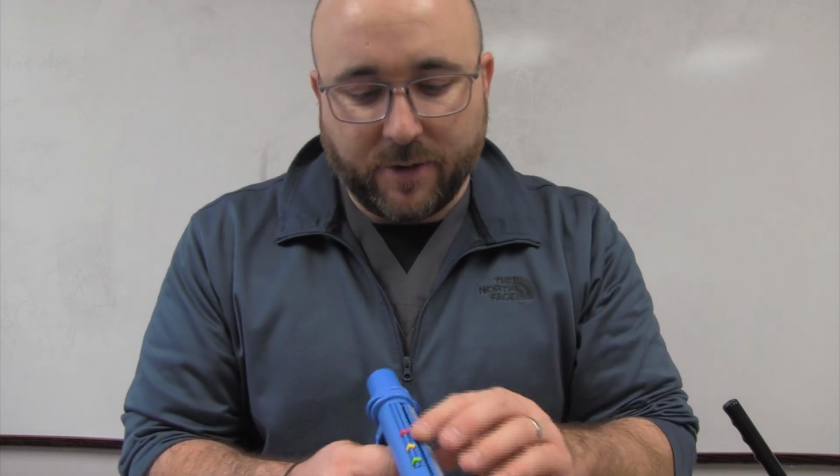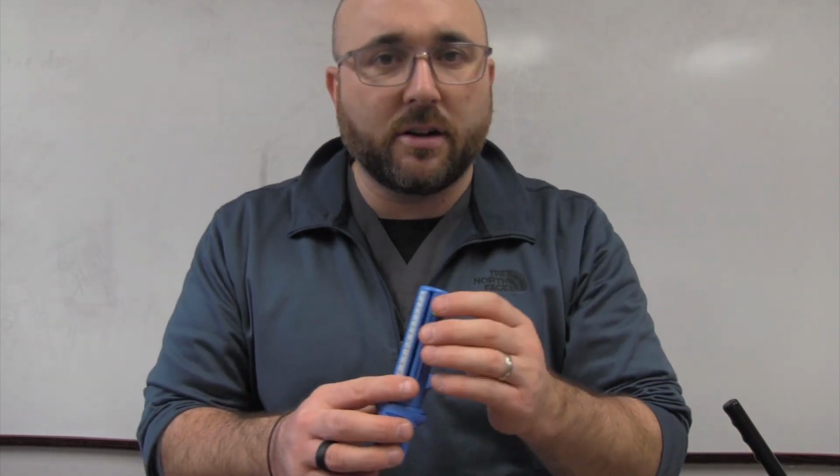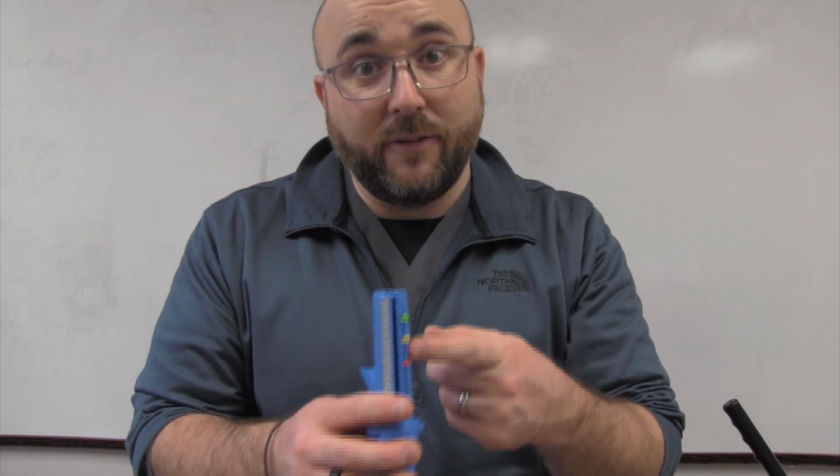So what you're going to look for is the patient, if they're not feeling well, is going to do a forced effort and see what their peak flow comes up with. If their peak flow is in the yellow zone, so that's anywhere from yellow to red, they're going to be specific to taking maybe extra breathing treatments, maybe starting a steroid, something like that, calling their doctor. That's in the yellow zone. You like to be in the green zone. If you're in the yellow zone, that's not as good. If you're in the red zone, those are times when you know you're in an exacerbation. So these are times where you seek medical help.